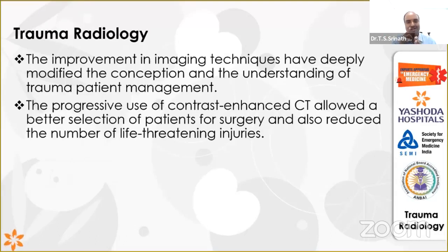So you can see in this X-ray how clearly you can see, because the problem here is whether you are going to differentiate what the diagnosis is. You ordered a chest X-ray AP view, and you are going to see whether this is a pneumothorax or flail chest or whatever it is, and whether there is widening of the mediastinum also. So these are the things which will be helpful for you, and look into what you have to do for these patients. Especially when you're seeing a chest X-ray, please concentrate. In my further slides, I will tell you what you have to do whenever you're looking into chest X-rays. Next slide, please.